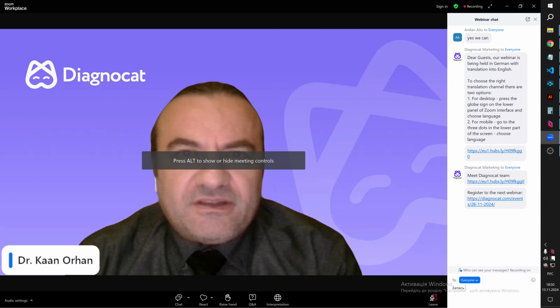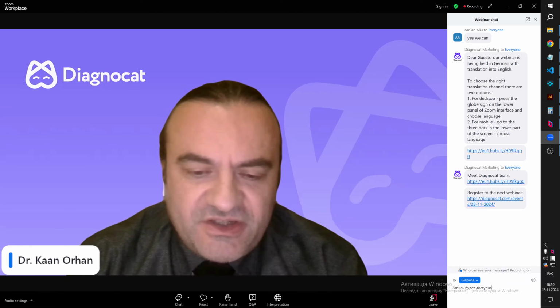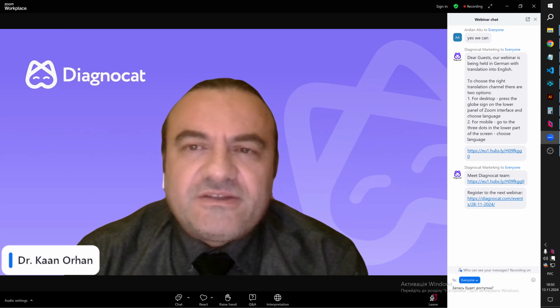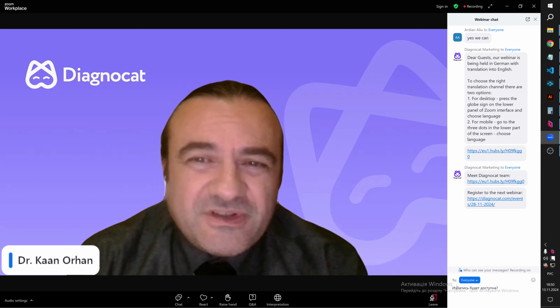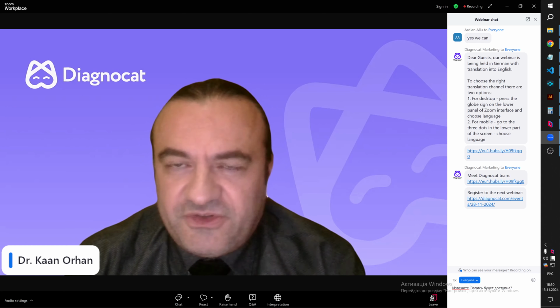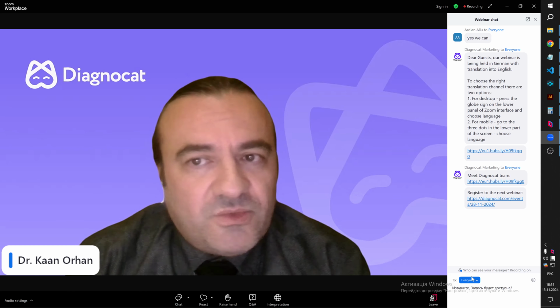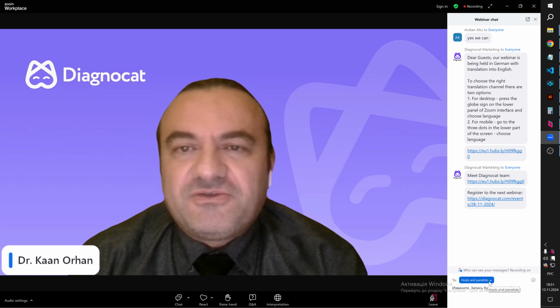As I already showed with the DiagnoCat product and also this 3D segmentation, we will for sure release the working length for endodontic treatment soon. So you can easily check automatically the working length of the endodontics and the treatment, not just from the 2D but 3D as well, but keep in mind about the magnification and so on in 2D imaging. But for the pulp segmentation, whatever DiagnoCat is measuring, pretty much you can use it.